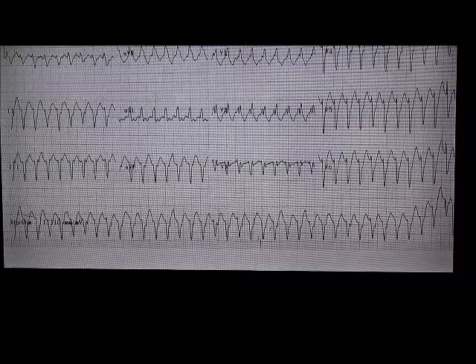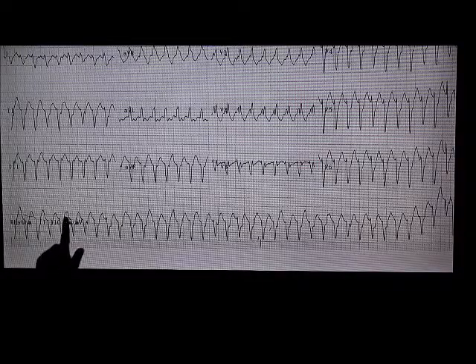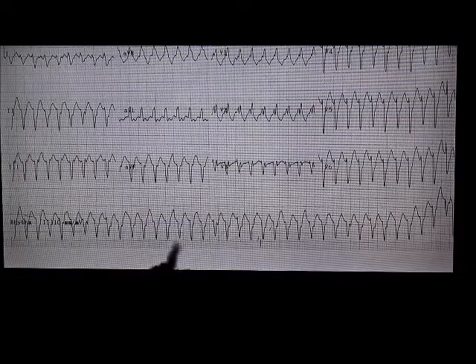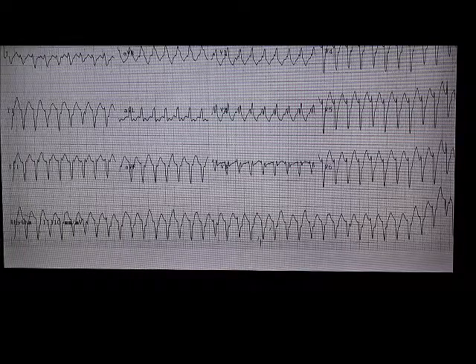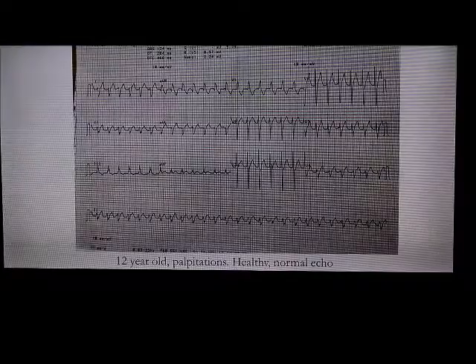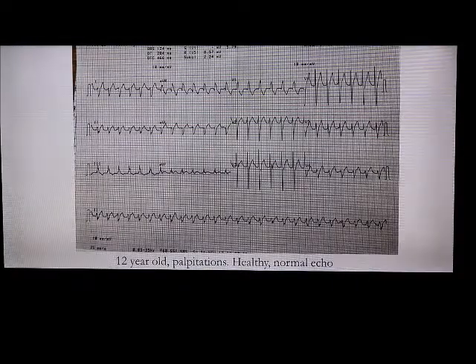For the ECG, you need to look very closely at the beat. So what is this? A deflection here, a T wave, and this one, and this one. Dissociation. Are they P waves? So this is AV dissociation. So yes, I agree, VT.